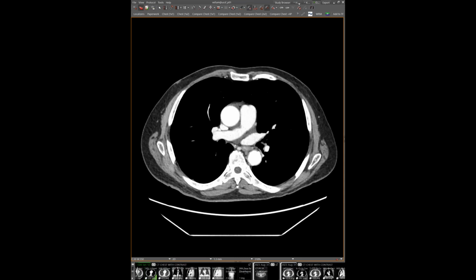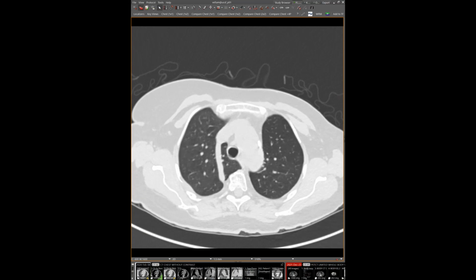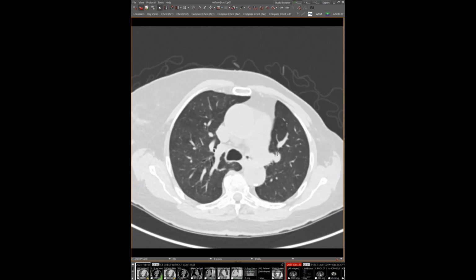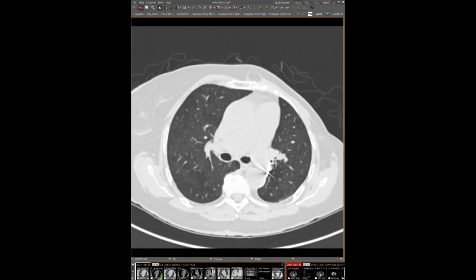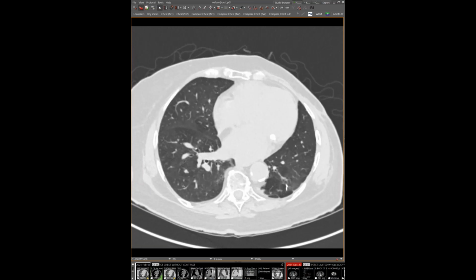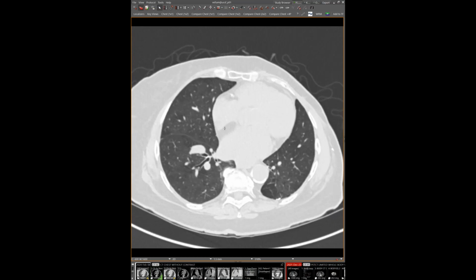All right. And then I have one other case, which would be great for Travis, but he's not here, but that's okay. So this is a woman, I think in her 60s, who has on CT some areas of sort of discrete nodules, like this little oval nodule in the right upper lobe. It does look like there's an associated airway with that nodule. And she's got a bunch of these, relatively small. I think that right upper lobe one is the largest, but the more you look, the more you see of these scattered solid pulmonary nodules.